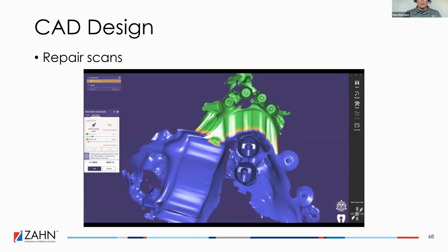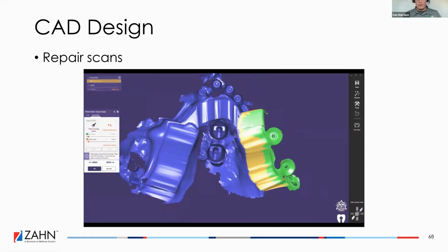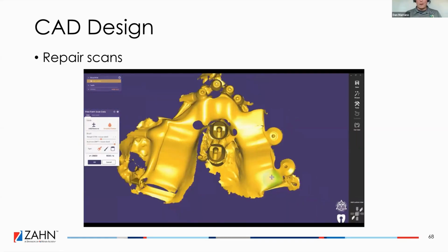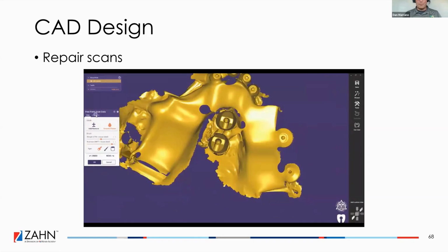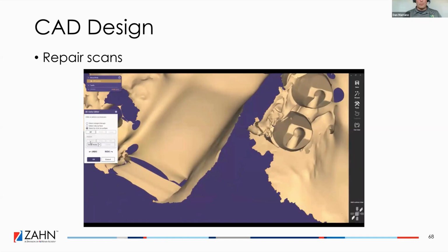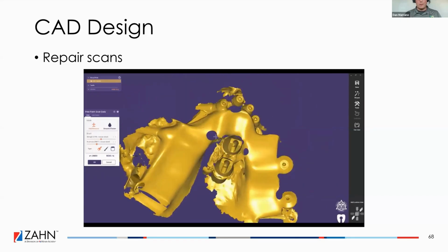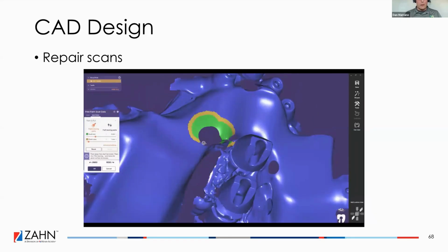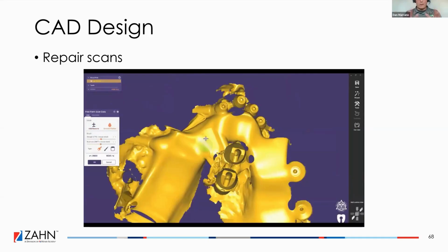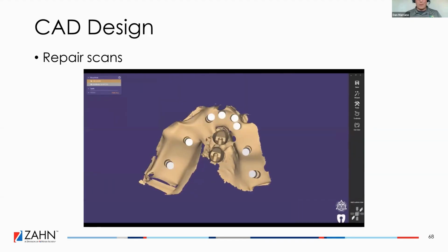I'm just getting rid of the holes, doing what I can to make this a blank canvas. Now, if you want to, you can bring this back in the original rough scan as a preoperative scan so that you can see where the tissue level is. Oftentimes you're not getting the tissue, you're getting maybe a scan of the bone or something like that, right? So it doesn't even matter if it is tissue. I wiggle this in exocad and I look for little glistenings in the scan, and that means it's got a little artifact.